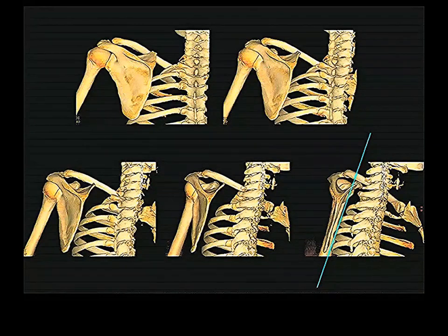So from front to back, like that. So I've got one section. Something people don't really appreciate, because the upper portion of the scapular blade is angled relative to the lower portion of the scapular blade, you get the supraspinatus in the same sections as the subscapularis.